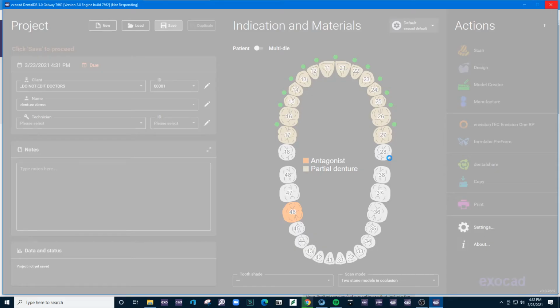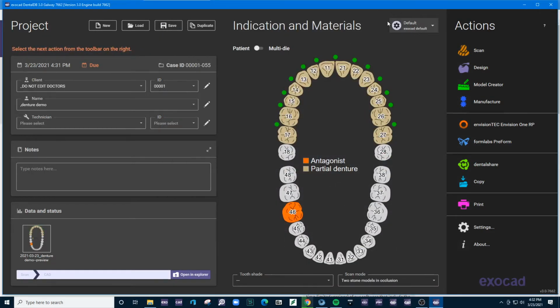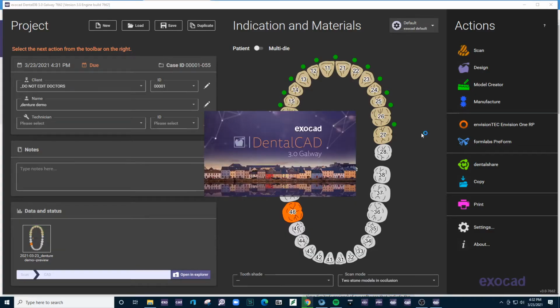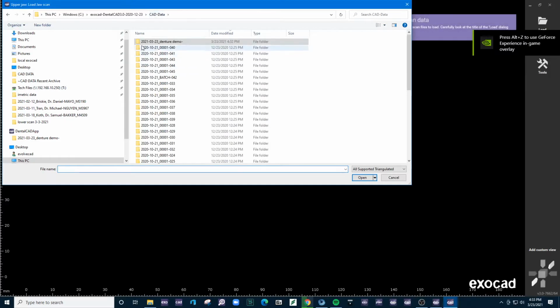Excited to bring to you the new suggested workflow for making a denture in the exocad base software. We are going to be using the partial module to basically activate the workflow and do the tooth pocket separation. Today we're going to be working on a case where we are making an upper copy denture and the lower is pre-existing teeth.